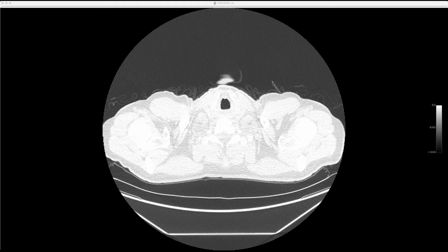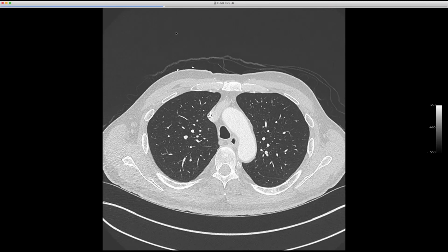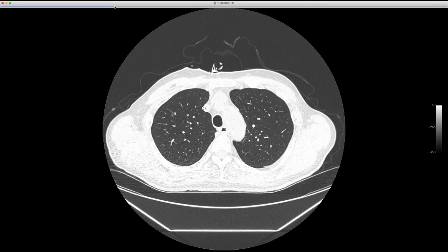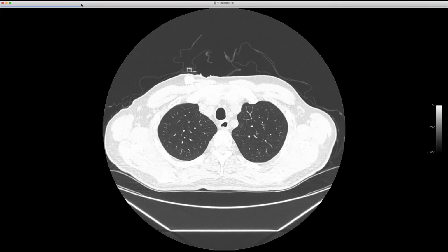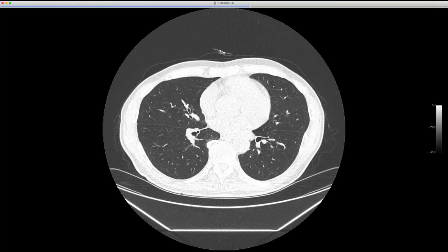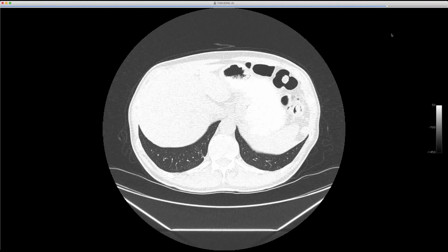Another interesting case, kind of along the lines of cysts. Let's see here. So this patient has some kind of urothelial cancer, and this is from 2016. And at that time, nothing exciting going on in the lungs. There's some rounded atelectasis in the left lower lobe, and then got a CT for surveillance. Had developed some metastases in the abdomen, and had these new cystic lesions in the upper lobes, well-defined walls, just scattered here and there, but really confined to the upper lungs, not much at all in the lower zones. One guy down there in the right lower lobe.